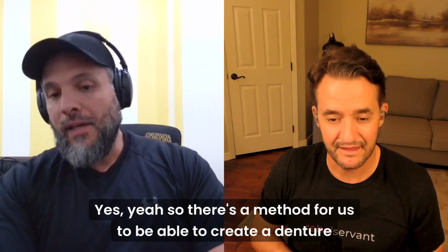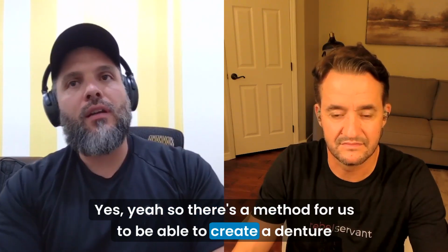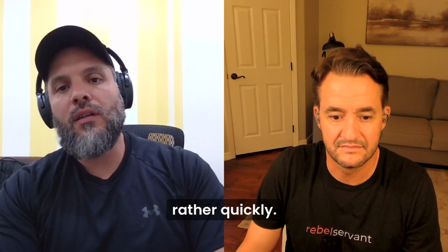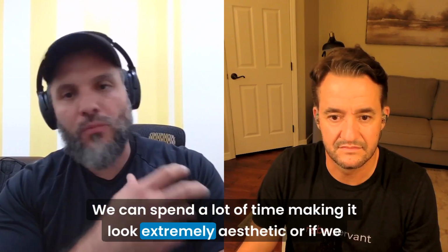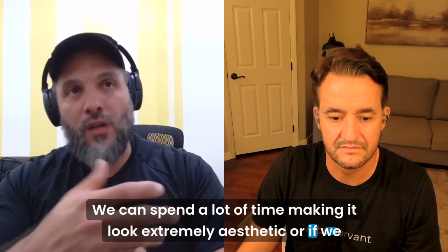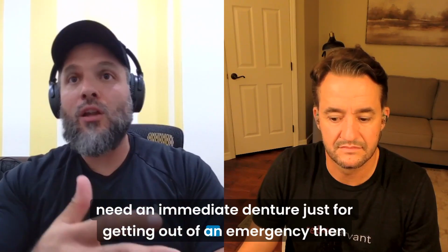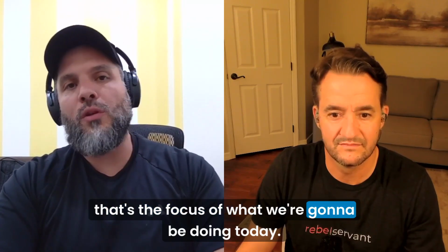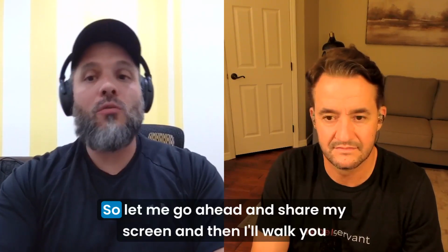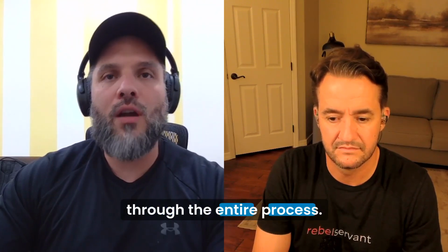Yes. So there's a method for us to be able to create a denture rather quickly. We can spend a lot of time making it look extremely aesthetic, or if we need an immediate denture just for getting out of an emergency, then that's the focus of what we're going to be doing today. So let me go ahead and share my screen, and then I'll walk you through the entire process.